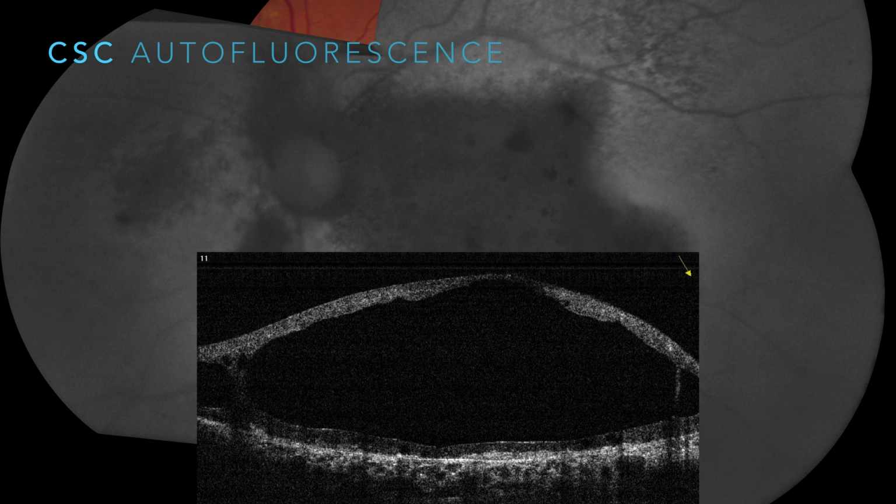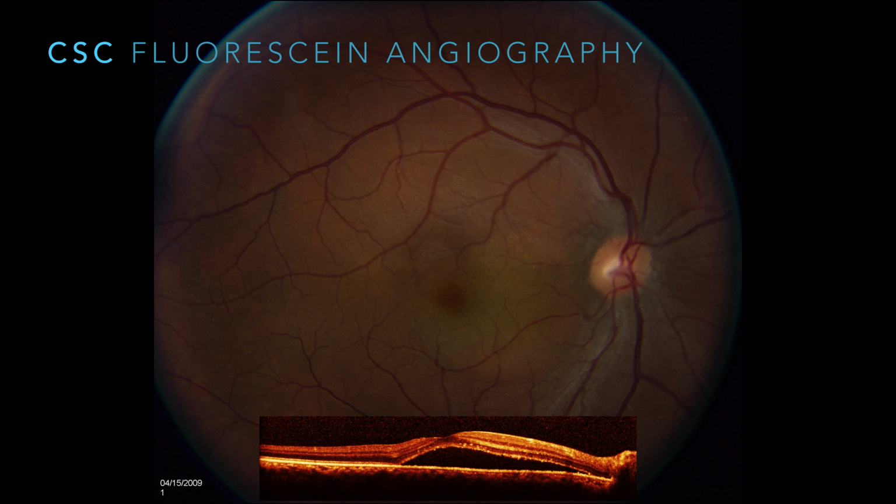I have a couple of other AMD patients that have this sort of picture, but he's got this large cystoid space, broken all the septae that were there, all the Mueller cells that were holding that retina together, and this patient does not have juvenile X-linked retinoschisis. This subretinal or intraretinal fluid probably started out as subretinal and then migrated intraretinal and then broke down those spaces, those walls. And here's another image. This is that same patient.